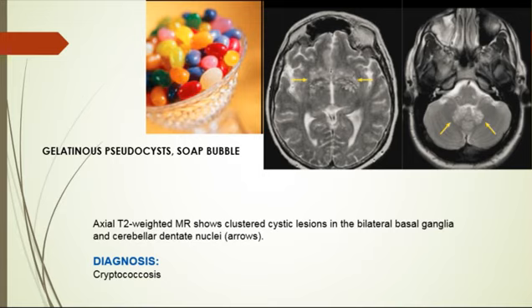Okay, three patterns have been identified in the brain: the parenchymal granulomas, gelatinous pseudocysts, and meningitis. Wake up. Okay, good. So these are the gelatinous pseudocysts presenting dilated perivascular or Virchow-Robin spaces filled with inflammatory cells and mucoid material produced by the fungal capsule. It dilates the perivascular spaces.